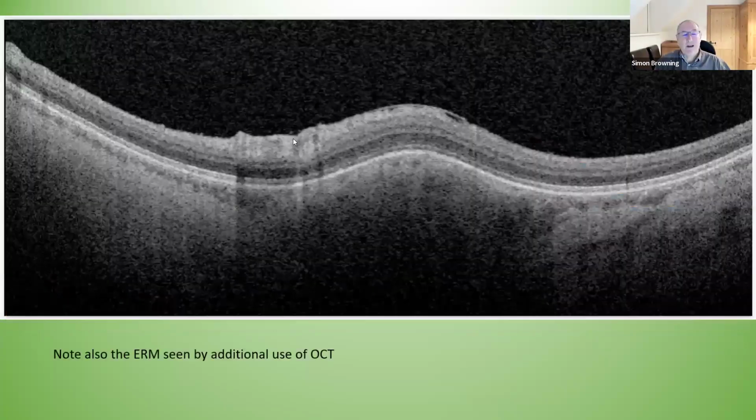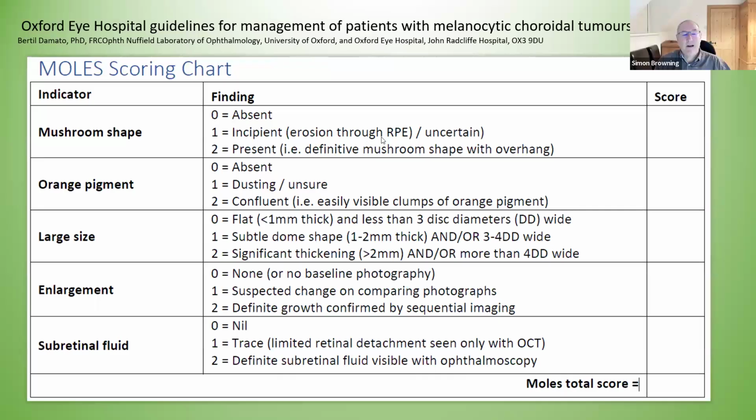And there's the very nice view of the epiretinal membrane there as well. So just to bring up the mole scoring chart again, I know I brought this up to you before, but hopefully now you're all using the moles chart routinely in practice. If you're not, please do start looking to use it because it is a very, very useful thing here.